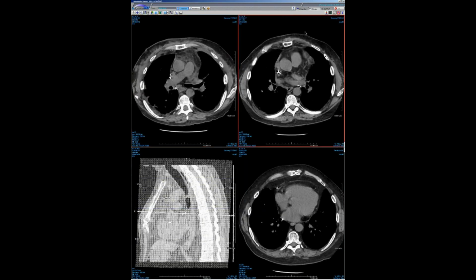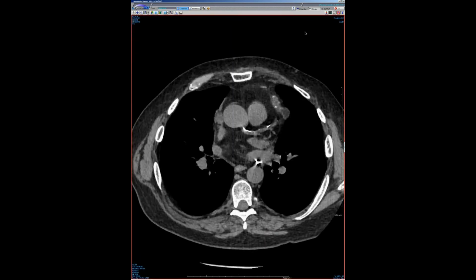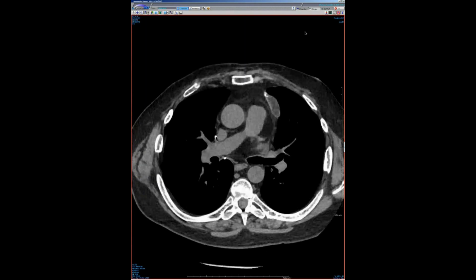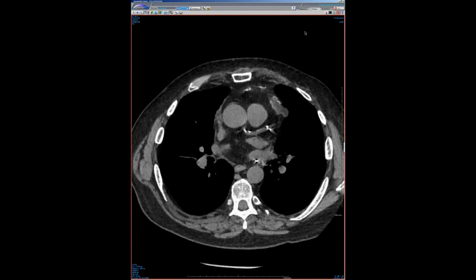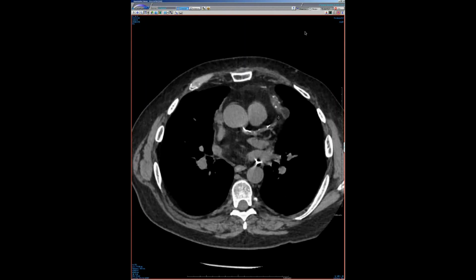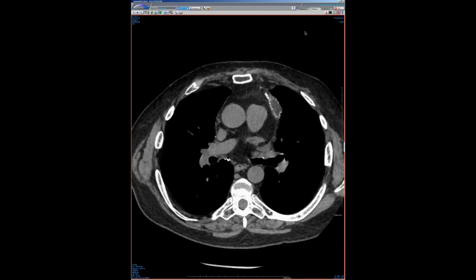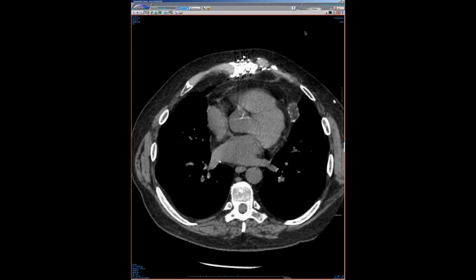I think so. So here is just a nice evolution. This fatty mass, he was doing the whole anterior mediastinal mass differential, and it's going into teratoma and some things that wouldn't really even fit for this, but it's a fatty mass. A lot of us would look at this and say this is clearly not a typical mass that's got rim calcification. It has a linear morphology.